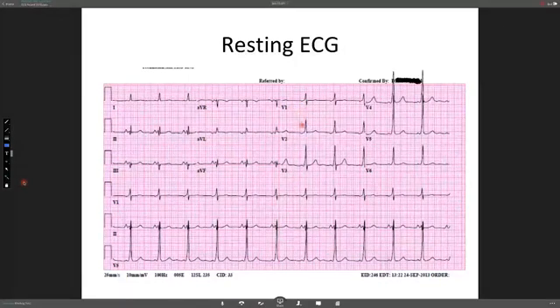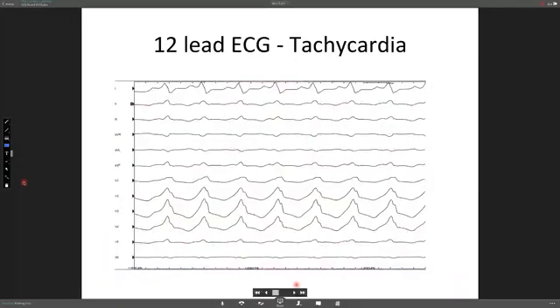If the delta wave transitions from one direction to another early on, in V2 or V3, this suggests it's mainly septal rather than lateral. If it doesn't transition or transitions quite late, then it suggests this is very lateral. And then you look at AVL and lead 1 and the inferior leads to help you decide whether this is anterior or posterior. This patient obviously went into the EP lab.